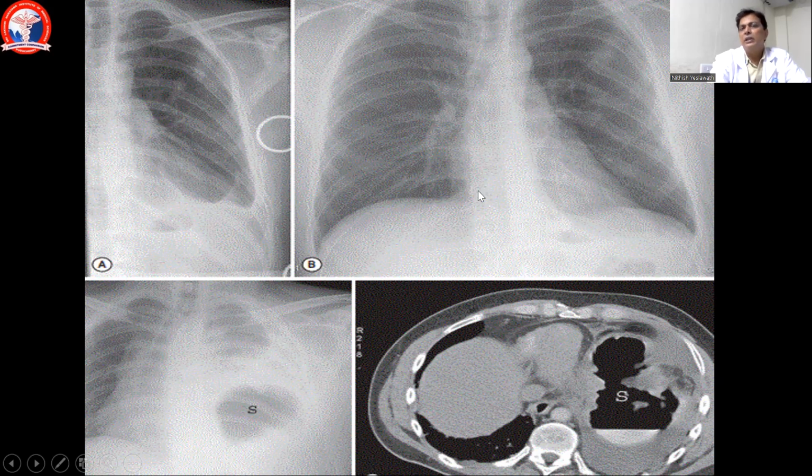That was the status. Then after a month or so, this radiograph is taken. Other than the rib fractures, the large hemothorax is almost resolved. Minimal blunting of the left CP angle is seen, but otherwise it has largely resolved. After a month, with some activity by the patient, the diaphragm, which must have been injured in the first place, has given up, and rupture of the diaphragm has happened.